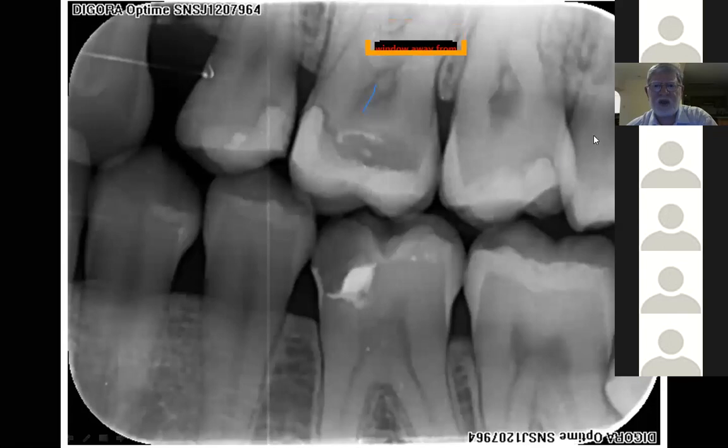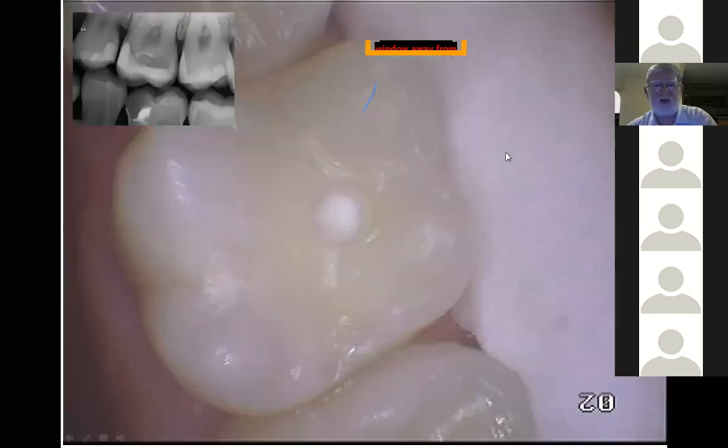Same patient, caries anywhere? Again, let's see which teeth. Okay, good. So 2-5, 2-6, 3-6. Again, we're looking at that area there. We're looking at this area all across there. And the 7 across there. Okay, so I'll ask you to keep in mind that you're seeing this radio-opacity there. And let's go on to the next picture.